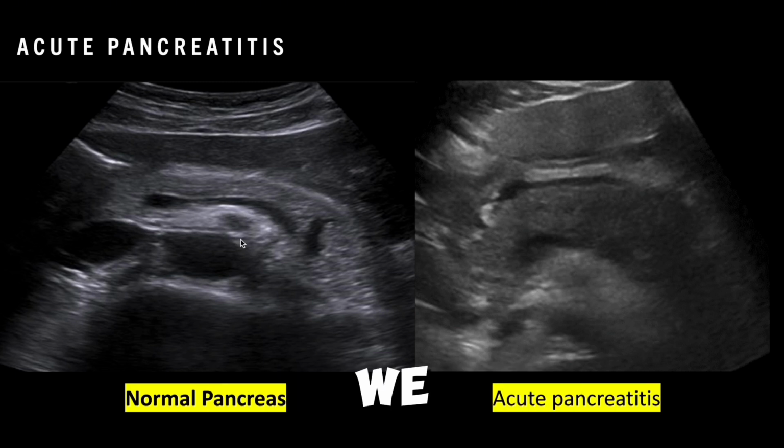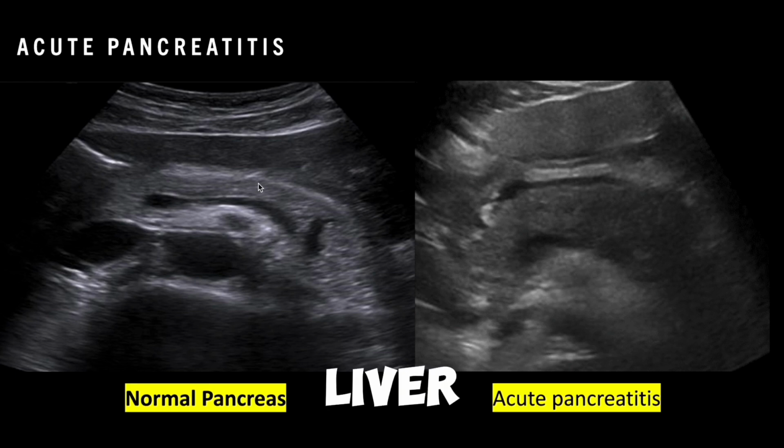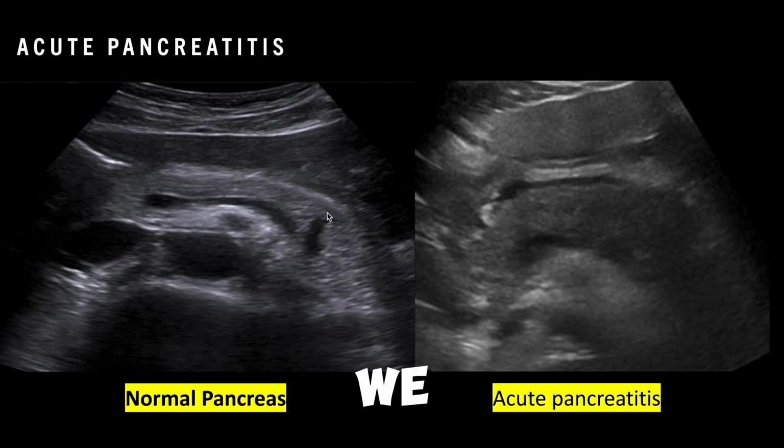So here in this image, we can see this is the normal pancreas. This is the left lobe of the liver. This homogeneous hyperechoic structure is the pancreas. So we can see the echogenicity of this pancreas is hyperechoic compared to the surrounding liver. But this image is of acute pancreatitis.